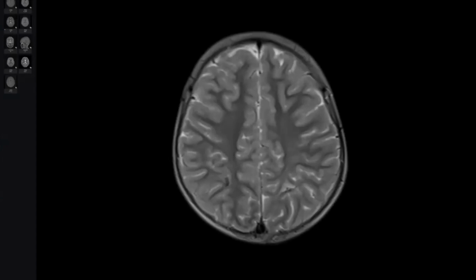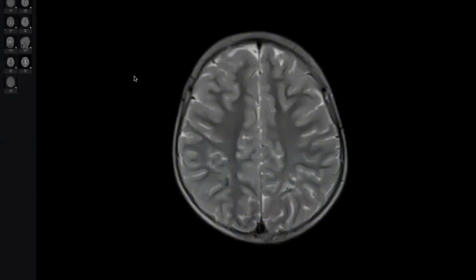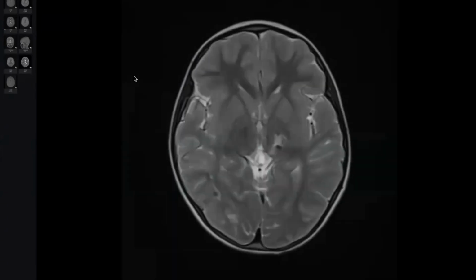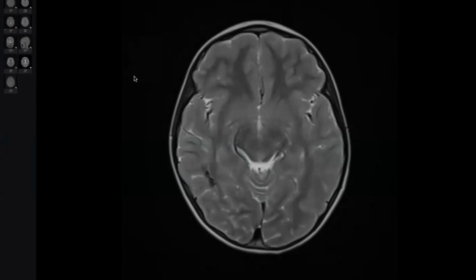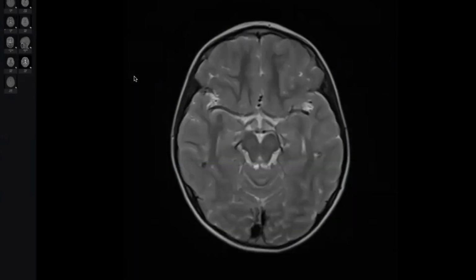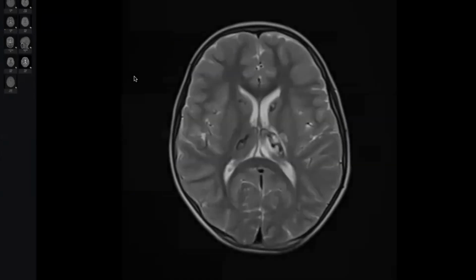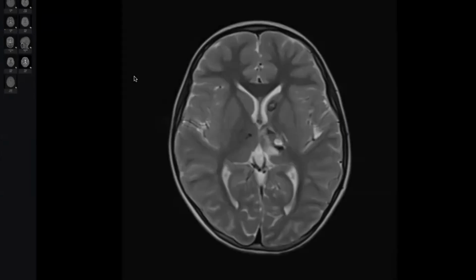See my colleague, the trick here. What is the trick? The patient is 8 years old. Really very tricky, and this is a typical Viva scenario. He brings you a very common pathology at a very atypical age. Most of us expected cavernomas in adults, young adults, and all of us diagnose it very well.